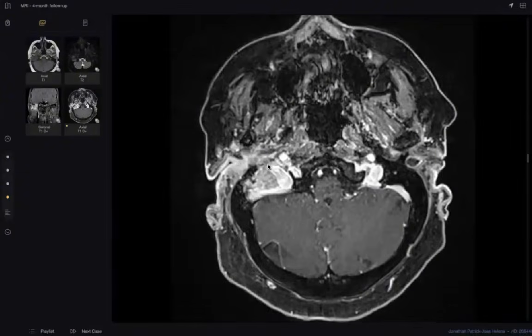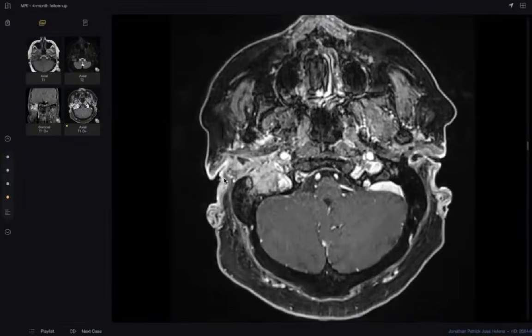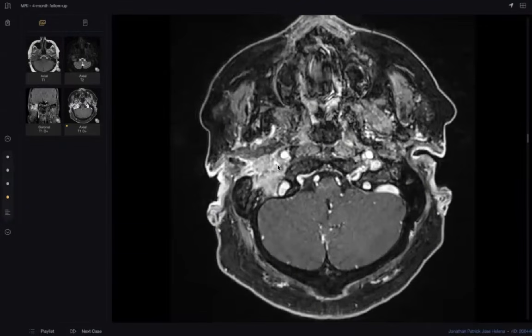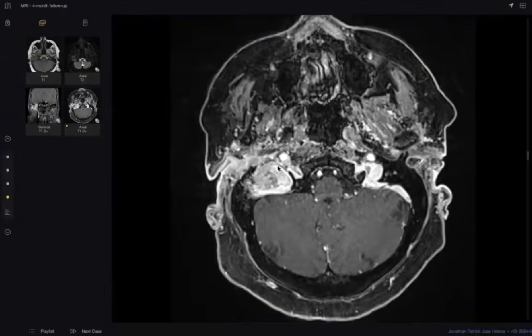If you look here, this is a soft tissue mass, enhancing. It becomes very obvious. The mistake, I think, is either the radiologist missed this mass in his first report and did not warn about it, so the patient waited for 4 months, or I don't think the patient refused to take a biopsy. Look here, the mass is very large, about near subtotally surrounding the ICA. And here it is markedly compressing the jugular and the sigmoid. Okay.